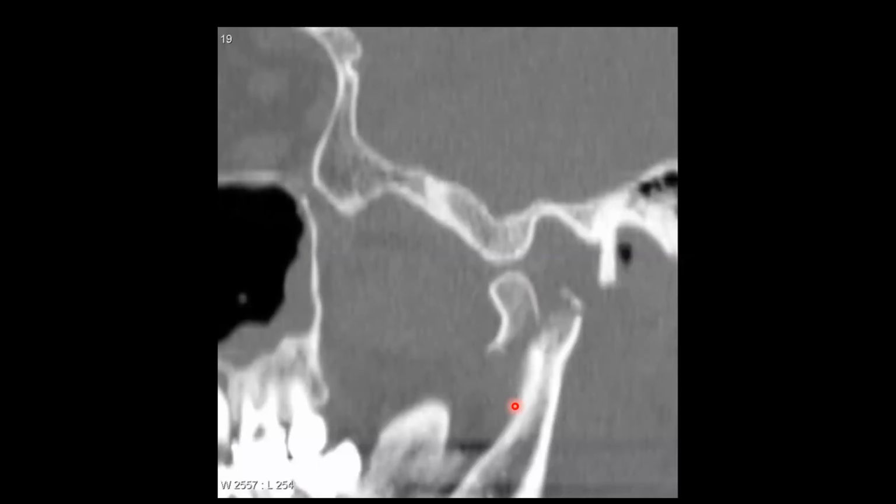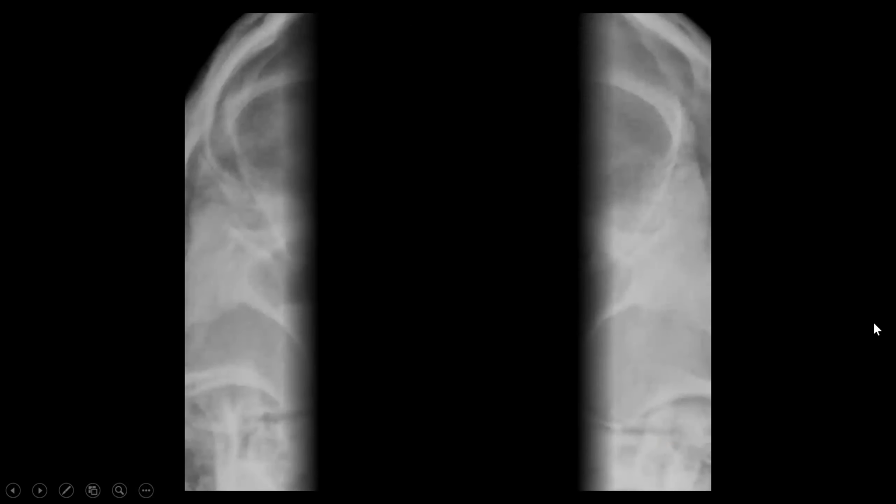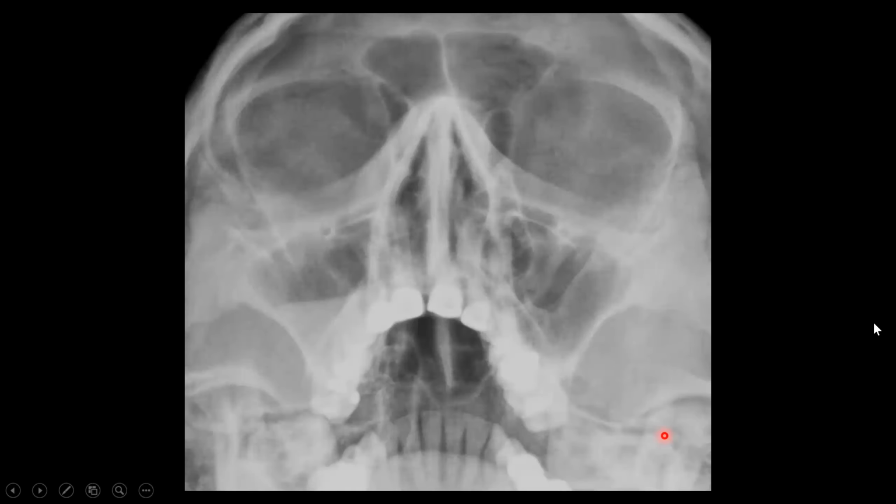Fracture of the condyle. If I ask you whether it is fracture dislocation or only fracture, you will say fracture dislocation. But if I ask you, is it normal or is there a fracture? So you will say there is fracture. Where is the fracture? Mandibular condyle. So I repeated these structures multiple times. What are these structures? You should know it, okay?